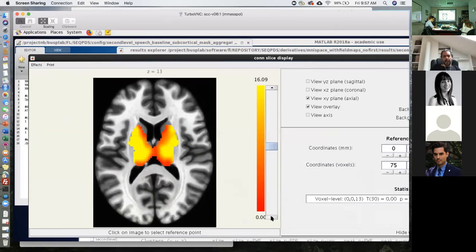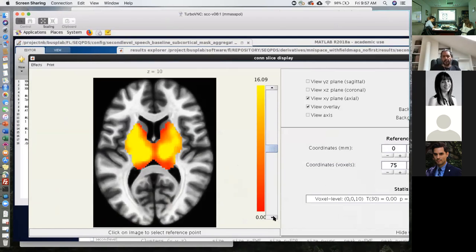So what is happening there is that, well, I don't remember the name. What are the names of those ventricles? The anterior ventricles, Jason? Lateral ventricles. Lateral ventricles. So the actual position of those ventricles across the subjects varies. The size and the position vary a little bit even after MNI normalization, and we are running first level analysis that actually performs masking to determine which ones are in-brain voxels versus outside of the brain voxels.